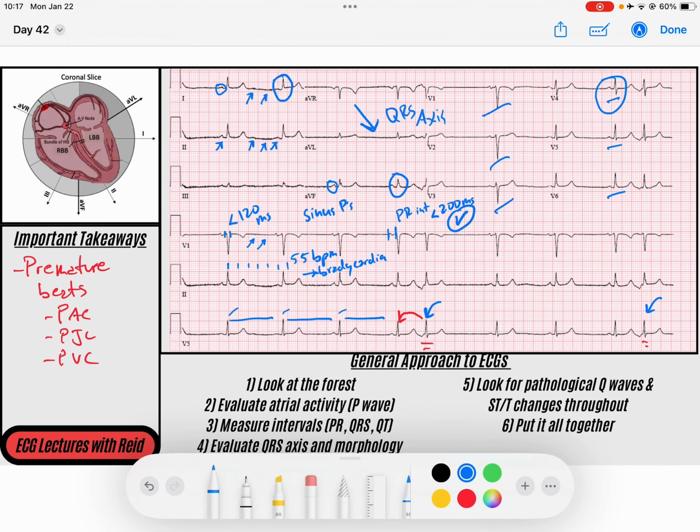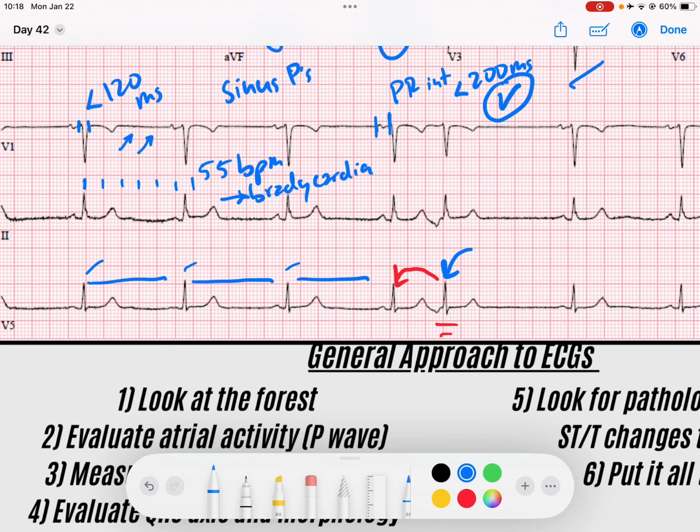That cancels out a premature ventricular contraction, because the PVC is going to take an aberrant pathway through the ventricles as it arises. If you look in the top left corner here, a PVC travels retrograde through the ventricles, which is not typical of normal AV node conduction. So I want to look in front of the QRS in this early beat and see if there is some P wave activity. You can notice a little downward deflection that does not appear at the end of our other T waves. This is evidence of atrial contraction.